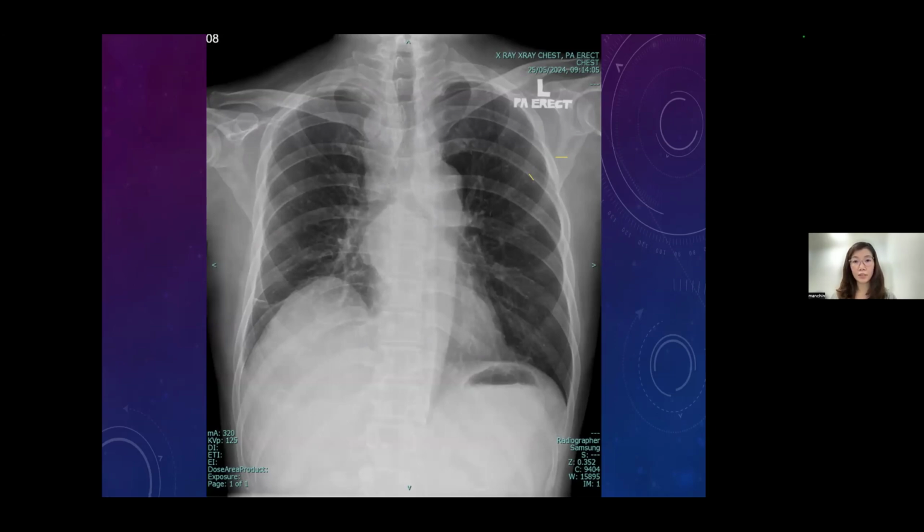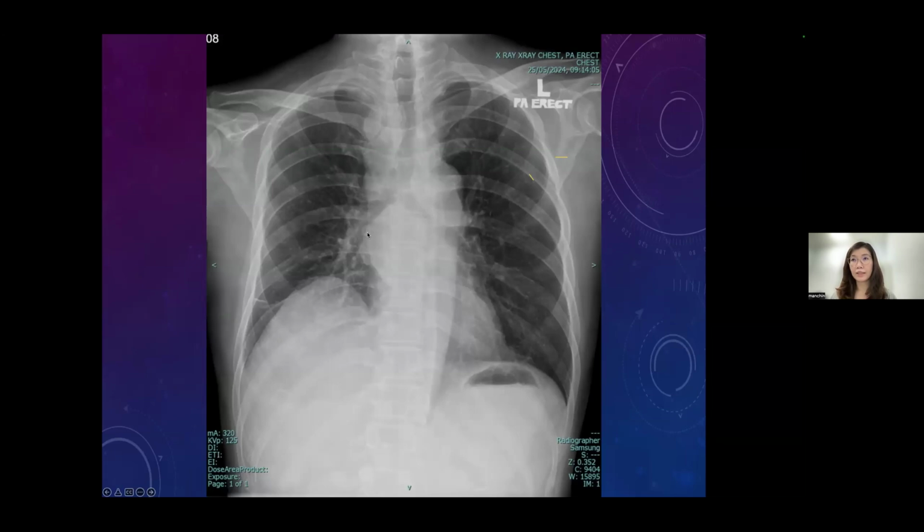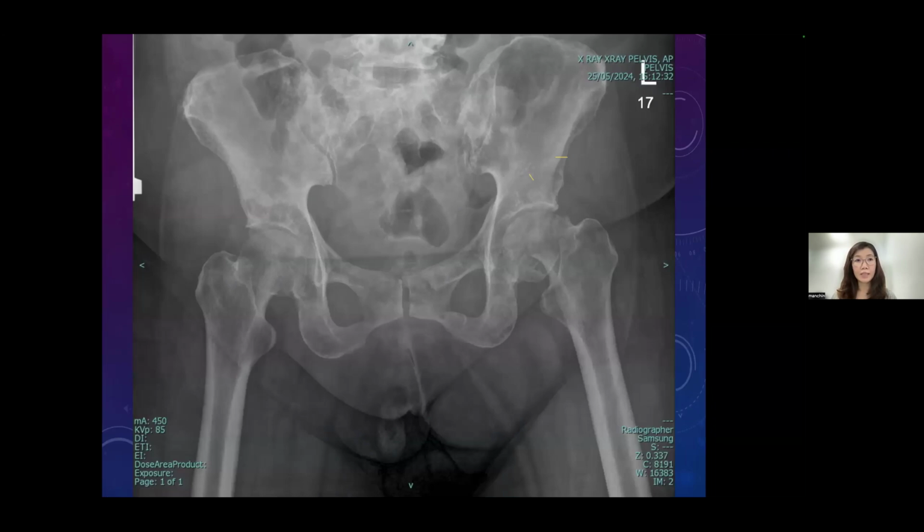Okay, so going to the CT of this patient, you see there's huge multiple metastatic nodes at the mediastinum as well as both hilum here. So this is the nodal mass in this case. So again, remember, look at the carina angle and then some opacity filling up the whole mediastinum. I think this is a lymphoma patient. Lymphoma or mets.